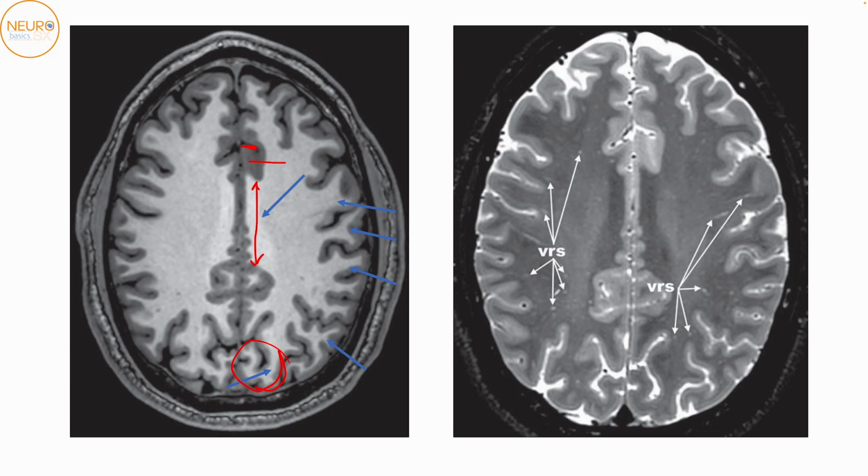There are basically sheets of arachnoid which sometimes extend along blood vessels and form dilated spaces running around blood vessels, and these are called the Virchow-Robin spaces. There are times when you can see these in imaging. They appear as T2 hyperintensities and T1 hypointensities, like over here and over here. Nothing abnormal about them. These are normal findings in MRI.